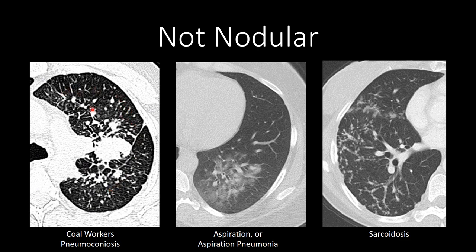This is predominantly nodular. Here we have some ground glass nodules that are all clustered together in a patient with dysphagia who had an aspiration episode. And this is aspiration pneumonitis, or maybe developing aspiration pneumonia. It's certainly patchy and ground glass. It is not peripheral in this case. It's isolated to the lower lobes and it's unilateral.